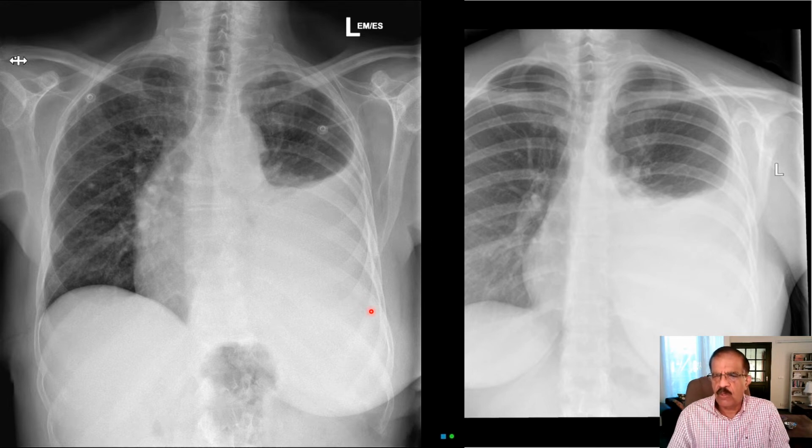Of course, there's a condition called parapneumonic effusion. If somebody has pneumonia and then develops pleural effusion, then the features of pleural effusion will be added. So you can see both these x-rays, and I'm very sure these are two different persons. This is pleural effusion, this one is also pleural effusion, both left side, and a female x-ray. You can't of course tell, but this is most probably either tuberculosis or maybe malignant. And in one-sided malignant effusion, you should always examine the breast, because it could be local infiltration.